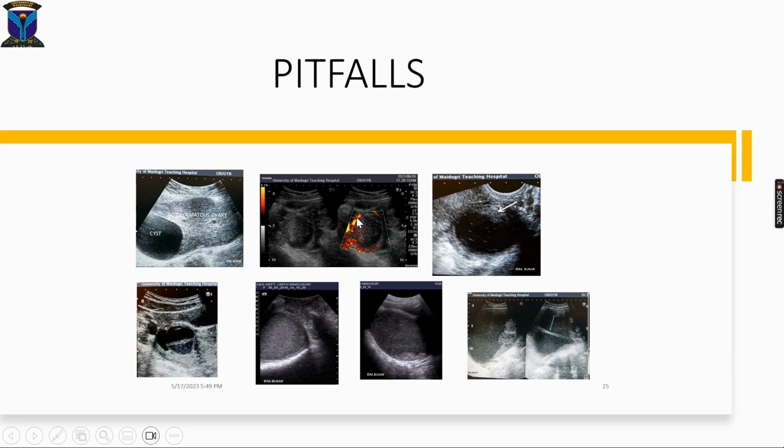The same thing, this was a case that was misdiagnosed as a solid lesion because of what looks like a solid lesion. These ones are actually artifacts. So again, hemorrhagic cyst. This here looks like a papillary projection, but this is actually clot retraction from hemorrhagic cyst, not papillary projection. Again, this case was misdiagnosed as a case of dermoid, but look at this retractile clot. And of course, it was confirmed surgically to be hemorrhagic cyst.